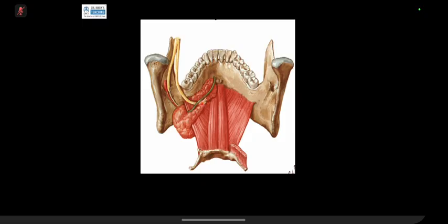Now, in our case, the submandibular gland was absolutely pristine. So whatever you were seeing on the scan was not the duct, where you confused it as if there is a stone. That is a totally different finding, where you will see a stone in the duct, and then there will be sialectasis, where there will be ductal dilatation of the submandibular gland.